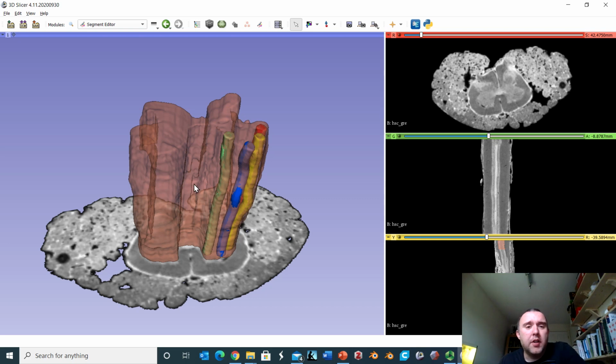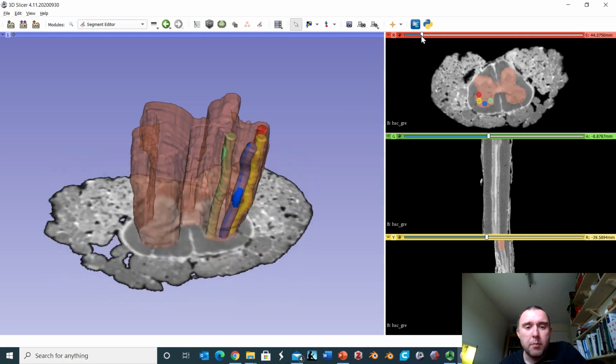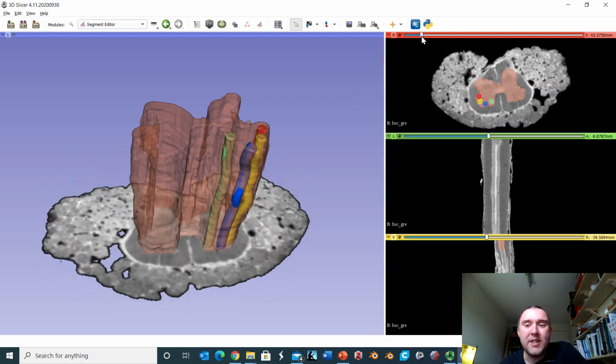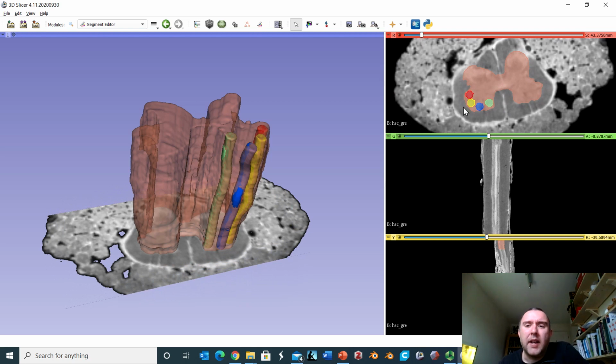However, when we look at the grey matter, we discover that the grey matter itself is not homogeneous. Not only is it separated into dorsal and ventral horns, but also these dorsal and ventral horns themselves have subdivisions. And this has been known for many, many years. However, it was only really in the 20th century that the functional implications of this became fully understood. What I've done is I've not actually done this entirely anatomically. I've semi-guessed where these so-called cell columns are, but they are pretty accurate.